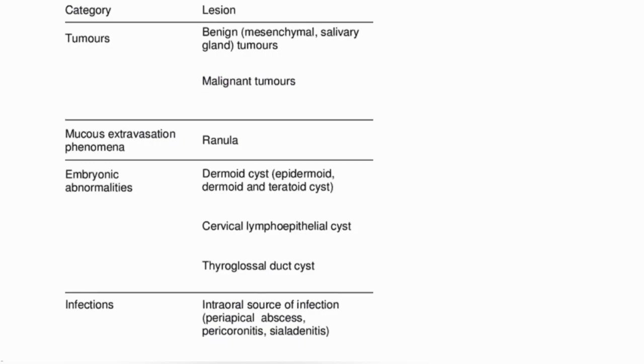Thyroglossal duct cyst is very common in this area, the floor of mouth, and infections. And you rule out infection by saying that there is no fat stranding, there is no abscess formation, no diffusion restriction in the center of the lesion. So infection is out in this case.